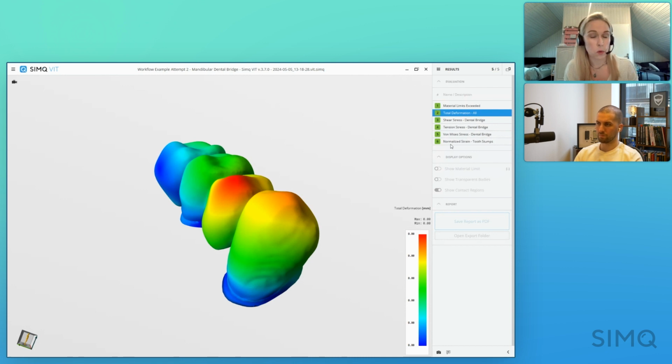It's not possible at this point in time to do individualized bone density or osseointegration. That is where the surgeon comes in, and the surgeon can say, okay, it's appropriate to do osseointegration, osteosynthesis, or they can say this bone is not healthy enough to put a screw in. So the VIT is implant design and doesn't account for bone density, but I'm hoping as digital twin technology improves, we can all have a patient-specific or an individualized medical twin. Wouldn't that be nice? Definitely.